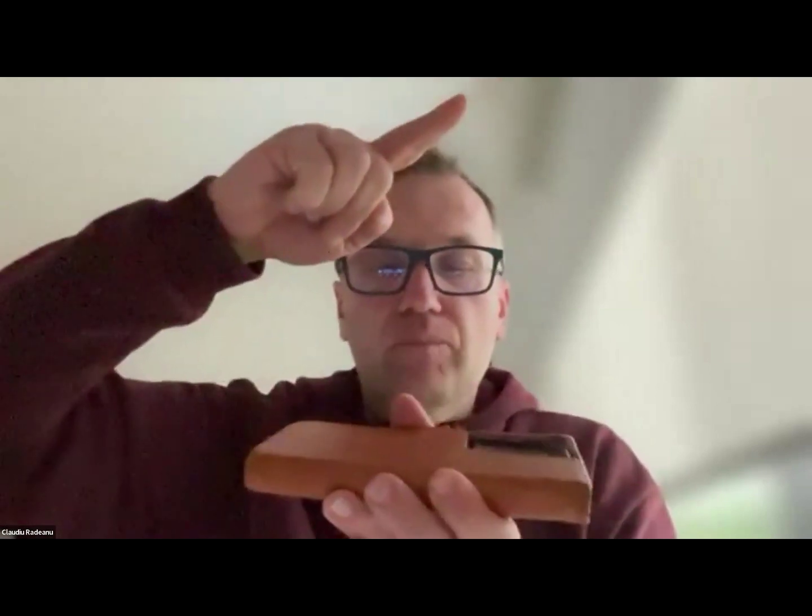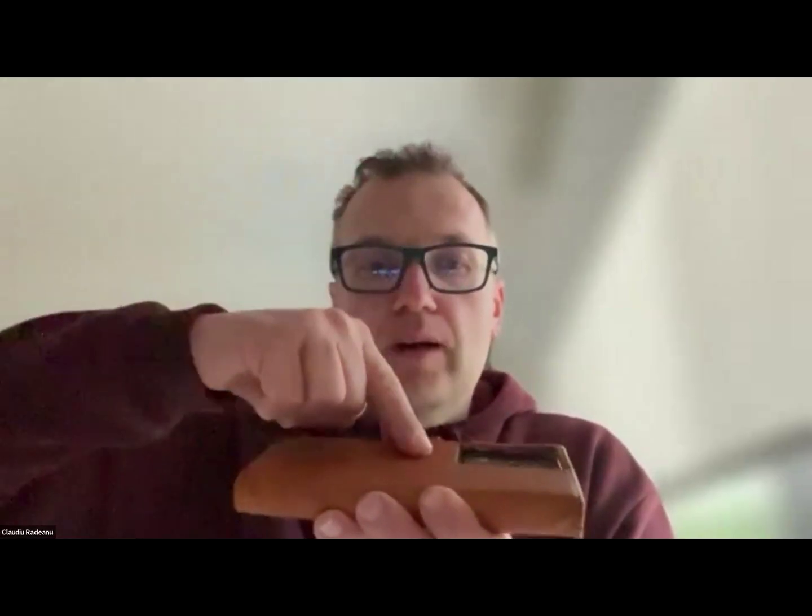Coming back, as I was mentioning, it is the same effect as having 2 mirrors in front of each other. The image keeps bouncing, and in between you have the soft tissue. You have the probe at the top, this is the skin, and air is above, and air is underneath the pleura. So the ultrasound wave comes from the skin, hits the pleura, and then bounces from the air and comes back to the skin.